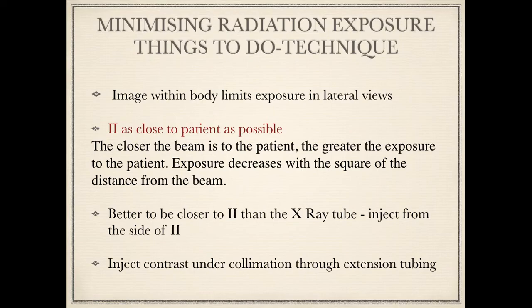So when you're planning the procedure, if you have a choice, like when you're taking a lateral image, if you have a choice on which side of the table you stand, then it's always better to stand on the side of the image intensifier rather than the X-ray tube. So it's always better to be away from the side where the X-ray beams are being generated from.